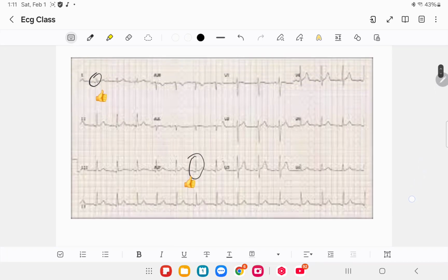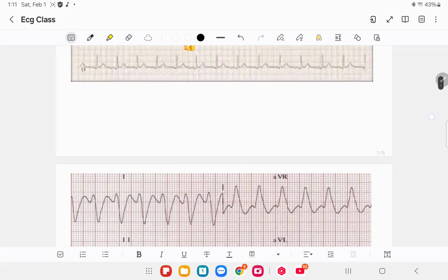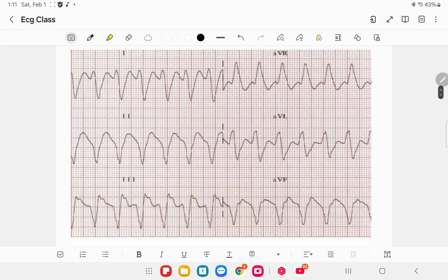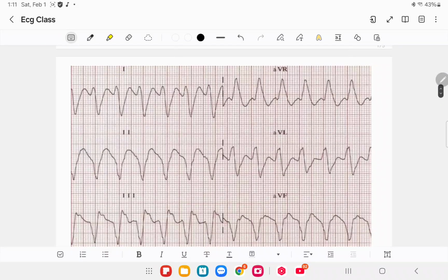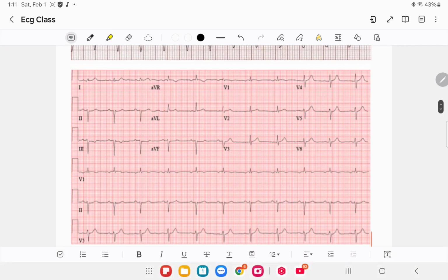So that's 2 examples down, right? Normal axis for both ECGs. All right, so we have a funny looking ECG here, but no worries, we're just looking at the axis. Okay, so lead 1 is here, and lead AVF is here. All right, okay, so let's go. So lead 1 is negative, right? It's mostly going down, the QRS complex, that is. So let's label that.